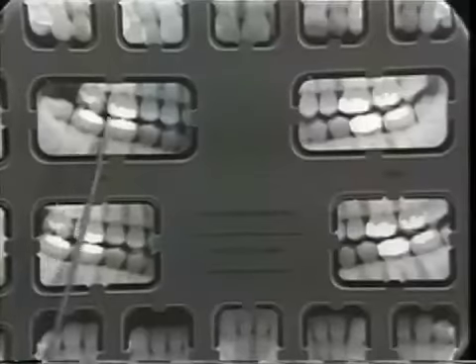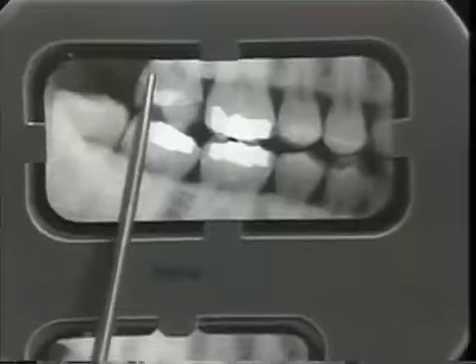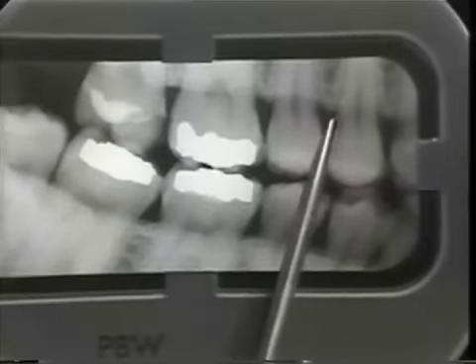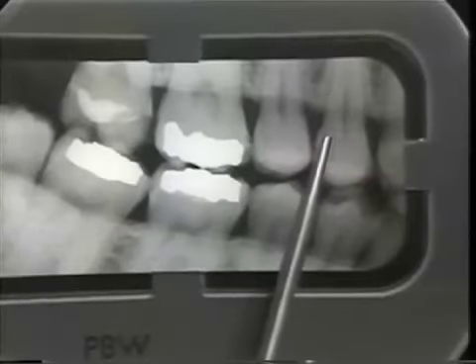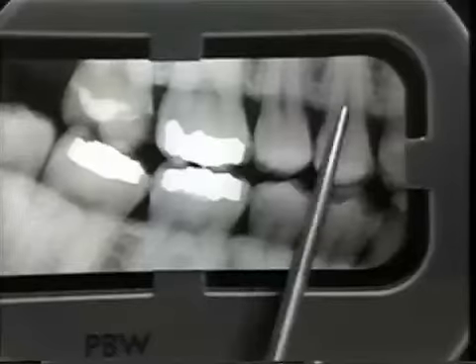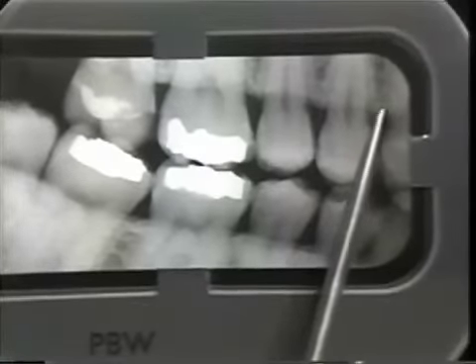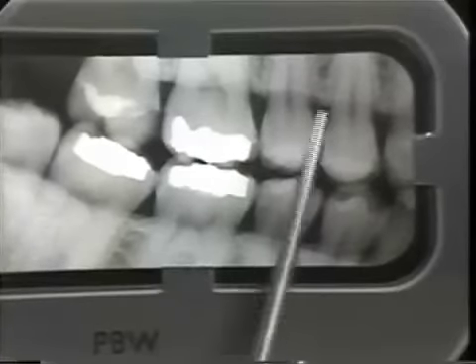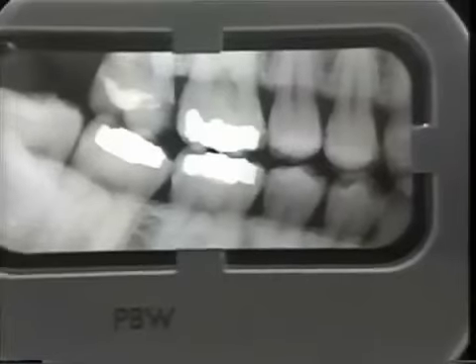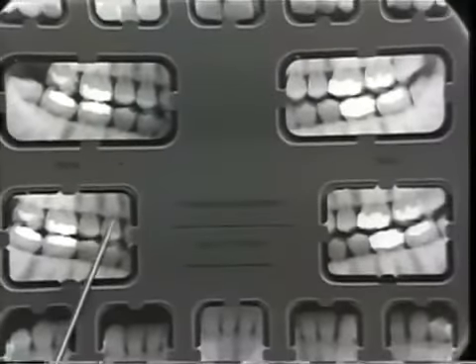If we look at the radiograph of the right side, we will again be checking for alveolar crest. You can see between number 4 and 5, it's a little high, a little bit more space between the CE junction and the alveolar crest. The alveolar crest itself is thick and continuous, and it looks good in that area. And we will continue to examine the teeth in the posterior bite wings to check the items mentioned.